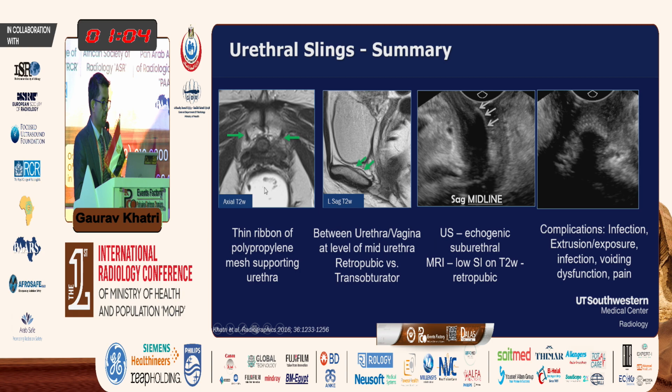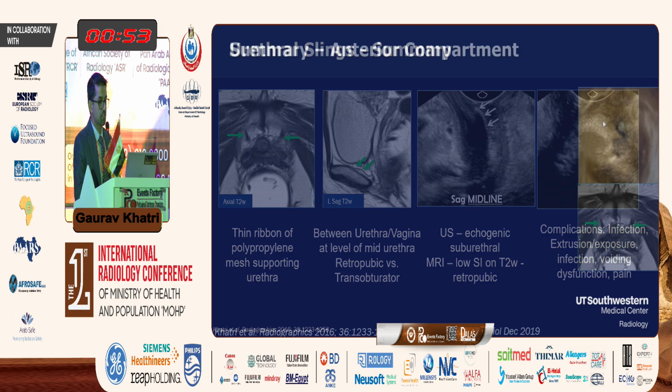So again, just to summarize, we're looking for these thin strips that are low signal intensity on T2 between the pubic bone and the bladder on MRI, and between the urethra and the vagina on the ultrasound, and always look for that crosshatch type appearance.